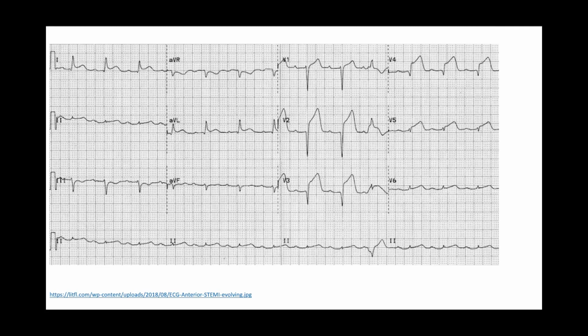Pause the video and give this one a try. Okay, let's start out by talking about the ST segments. Do we see any ST elevations?